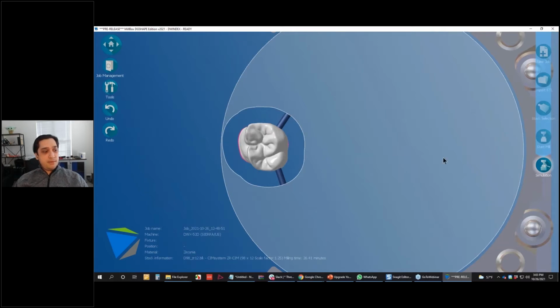Actually, for some reason my 3D mouse is not working. Let me just restart this real quick, get that fixed for us. Sorry for the delay. That's just going to take a brief 10-15 seconds for me to restart that, and then we'll continue again.